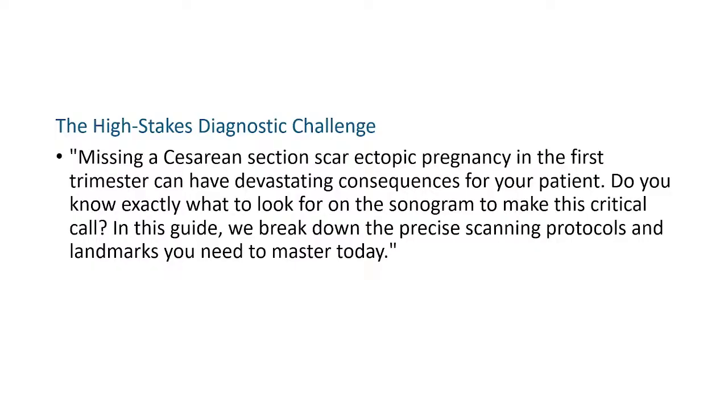So the high-stakes diagnostic challenge in the first trimester ultrasound scan is missing a cesarean scar ectopic pregnancy. That can have devastating consequences for your patient. Nobody wants to miss that from a professional standpoint.